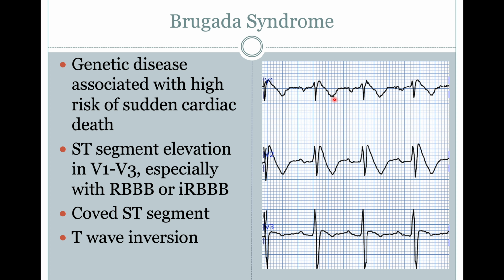There are other forms of Brugada syndrome that are a little bit more subtle. There's kind of a saddleback ST elevation and a really subtle ST elevation. I think those are a little bit more controversial. The one I'm looking to identify most of all, especially pre-hospital, is this one, with that diagonal line from the top of the QRS straight down to the bottom of the T wave.